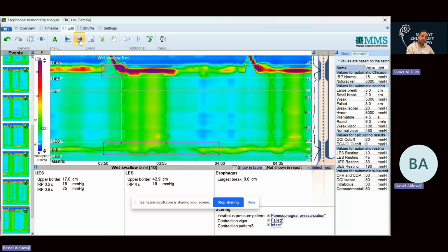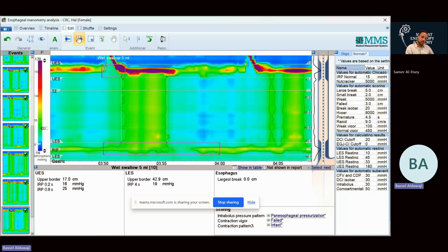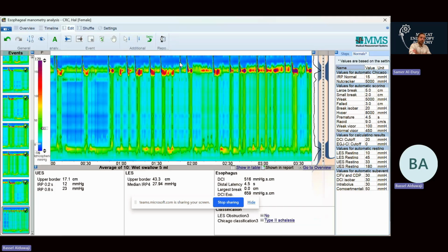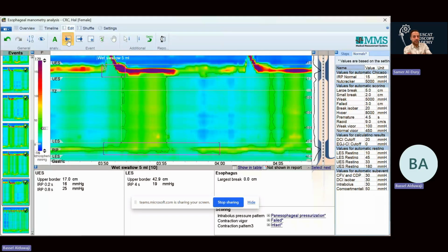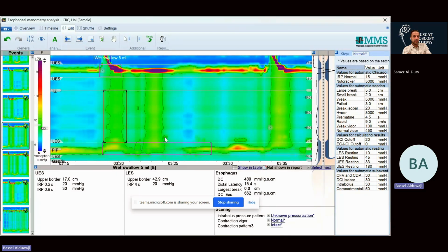You can see here how much the pressurizing has now become more stronger and more wider. Yeah, it's very nice. This is the average textbook clear stuff. Yes, and very clear. Yeah, it's clear as day. Yes, it's very clear.